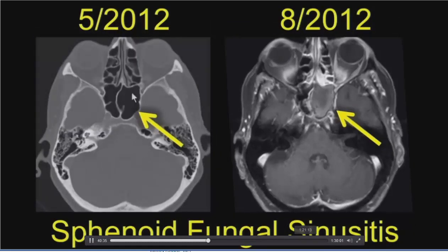And unfortunately, what they didn't notice was that just a little while before, that was normally aerated. What happened to this guy? Theoretically, we all walk around breathing in 50 million spores of fungus a day, depending on where you live on the fungus belt. Most of us are perfectly fine with it, but every now and then we get fungal disease. That can invade the surrounding structures, and in this case, it went from the sphenoid out into the cavernous sinuses. So it was really kind of a mycotic aneurysm of fungal origin. Sinus disease can kill you.